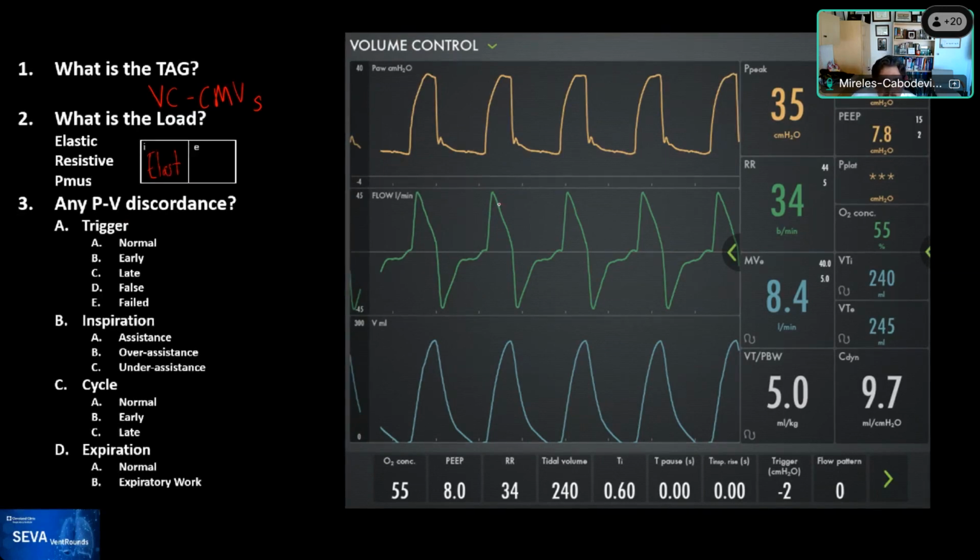So the load. You can see this doesn't look the usual way. So you see a component that empties relatively fast, right? It empties very fast, probably even in less than half a second. You lose a lot of volume. And then suddenly it flattens out.